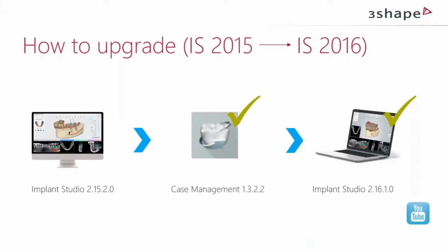All right, so now let's talk about how to upgrade from the existing version of Implant Studio 2015 to the latest 2016 version. Because if you are our user, then you don't need to install it from scratch as a new user, right? So it's easier to upgrade from the existing version of Implant Studio. So existing Implant Studio users will be able to upgrade to the newer version from Implant Studio 2015.